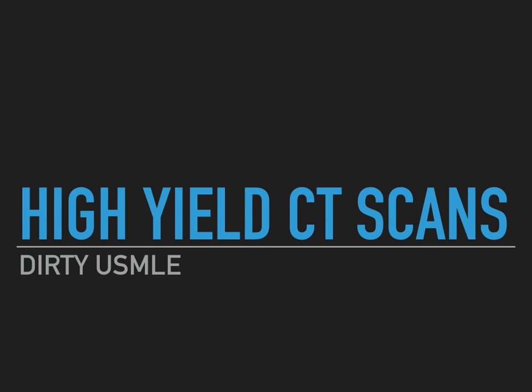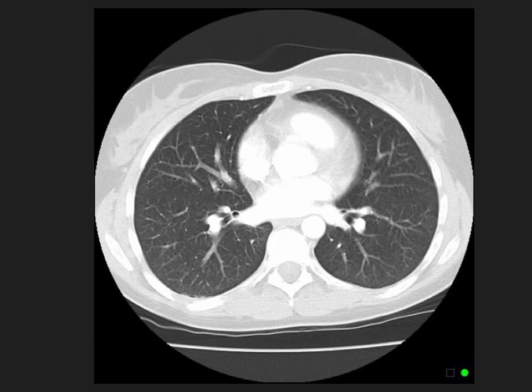So for today's video, I decided to focus on only the highest of high yield CT scans. I could show you hundreds of CT scans because honestly, there are so many different variations of them. But for the sake of time and efficiency, I've decided to show you what I believe to be the highest yield. So the highest yield CT scans are lungs, brain, heart, and abdomen. So we're going to get started.